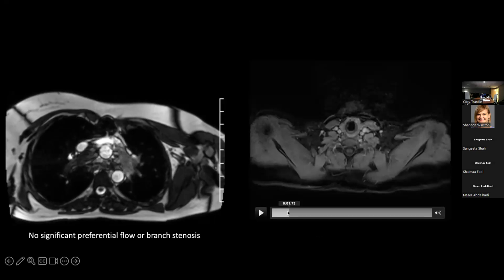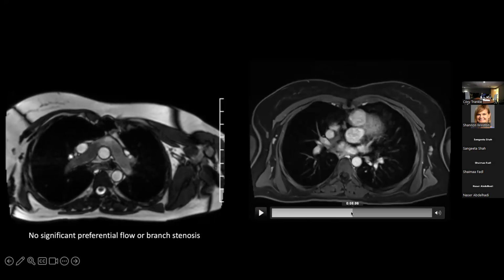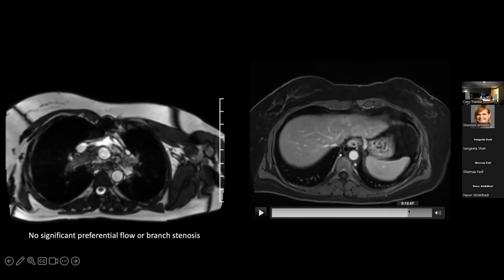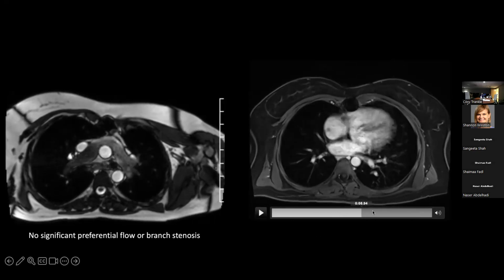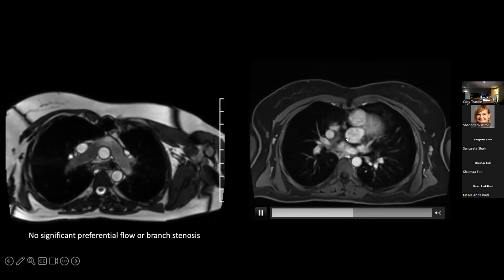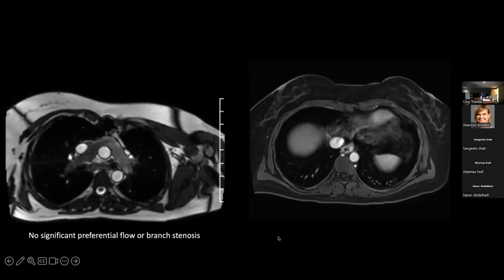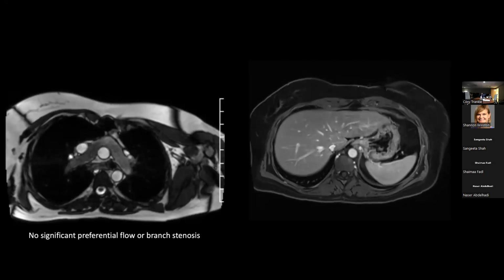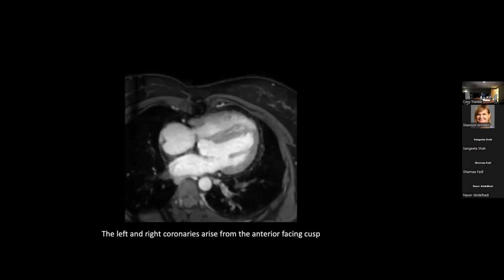This is the post-contrast VIBE of this patient. It's a good sequence to show the anatomy and everything close to the normal, and this is the waist-like narrowing of the PA. And it's good to see the branching of the pulmonary artery, but angio also is very helpful in such situations to give the accurate measurements.